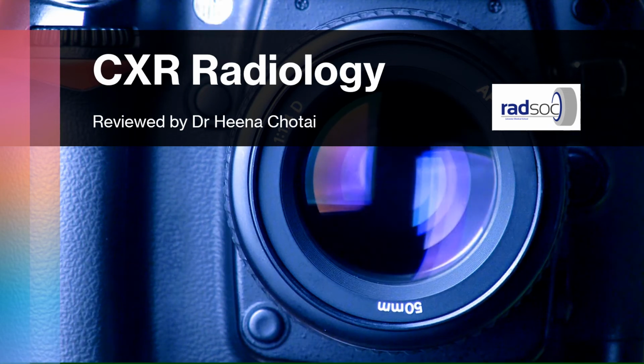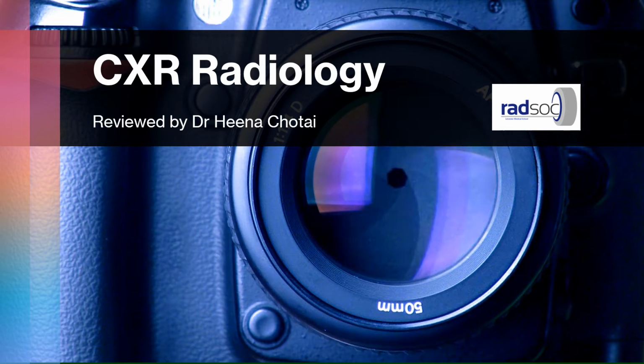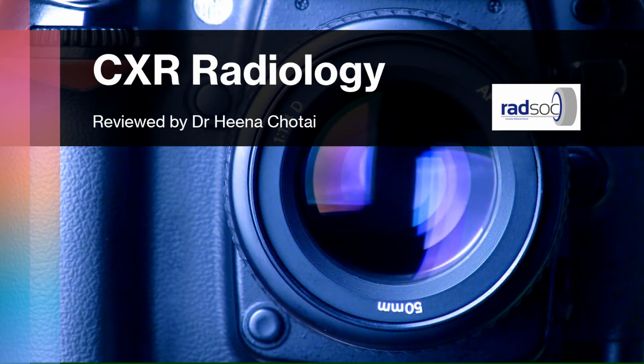Hi, welcome back to our Snapshot series, and this time we are going to focus on chest x-rays. So we will just be looking at different pathologies and different presentations that could come up and that you should be able to spot and know for finals. And this time we won't be describing the x-rays, we will just be focusing on the different signs that you can see.